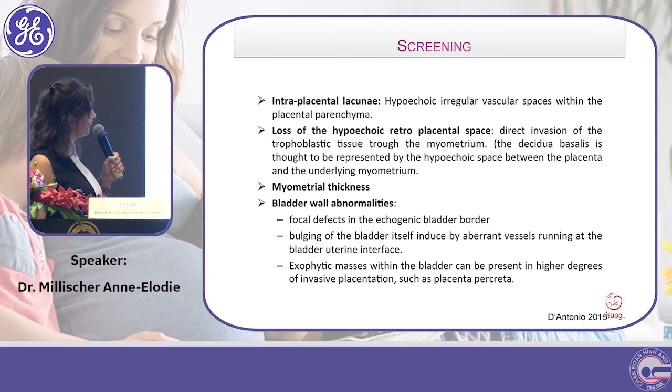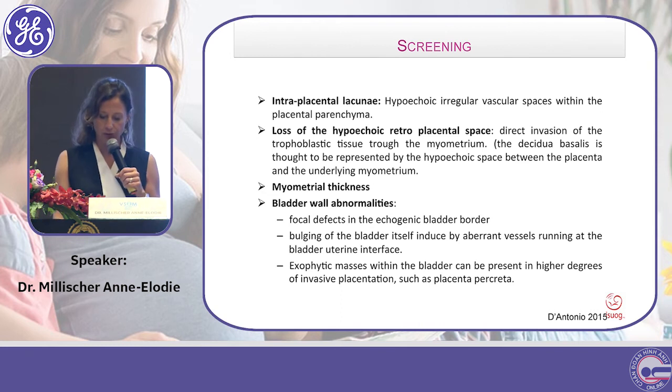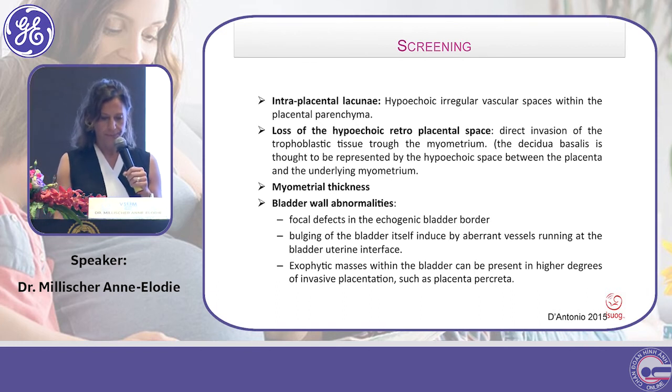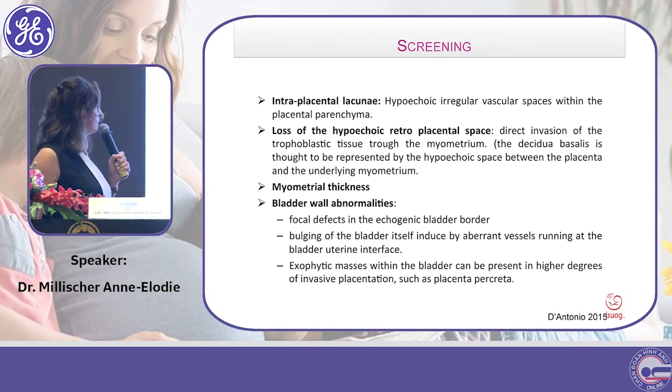Here you have little vessels just in the space between bladder and placenta, and there's a frequent hypertrophy of those vessels. Và các bạn thấy cái mạch máu nó đi qua nhau, bám tới gần tới bàng quang luôn. So the myometrium just in front of the placenta is very, very thin. Và cái cơ tử cung nằm ở cái vị trí mà nhau cài đó rất rất mỏng.